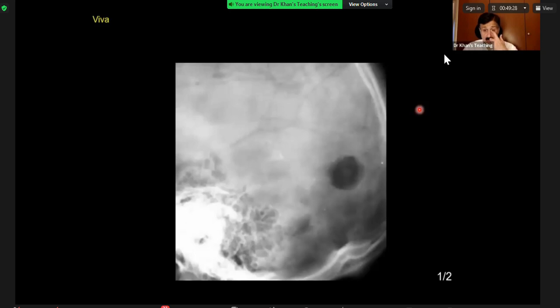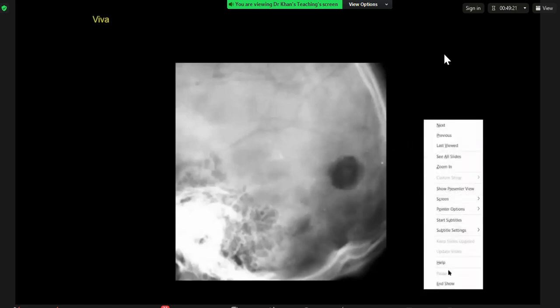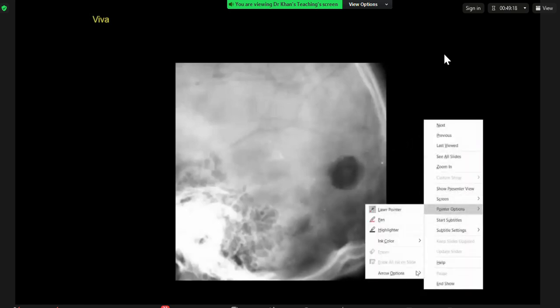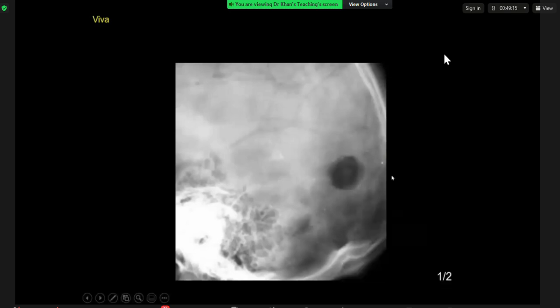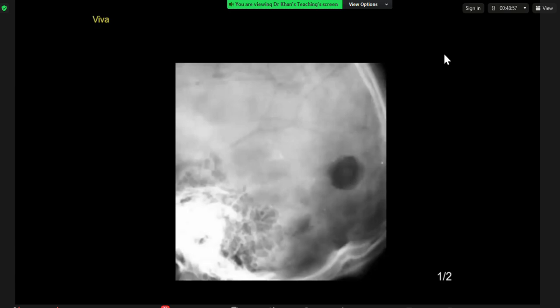How will you describe this and what is your differential? So this is a lateral skull X-ray, which demonstrates a focal lytic lesion. I'm looking specifically at the edge with some fading opacity. So that's in keeping with the bevel edge. So my impression is that this is an LCH. But there is a central focal hyperdense focus, so it could represent a button sequestrum.